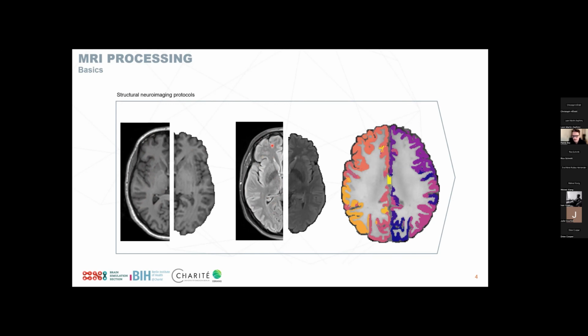This is what, if the patient comes into the clinic with stroke symptoms, we want to see where is the lesion, what type of lesion, etc. So this is where we have the focus here. And what we want to do is we want to start with this full MRI scan, right? Even containing the skull, containing all this individual properties, and we want to end up with a fully processed image. I just highlighted this here as, I mean, the only thing that we really see here is that it is brain extracted. So we removed everything, skull, all organs around it, and we end up just with the brain.